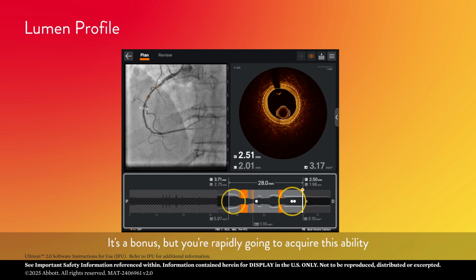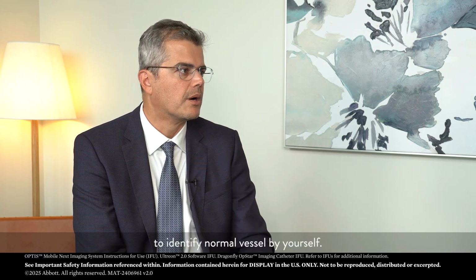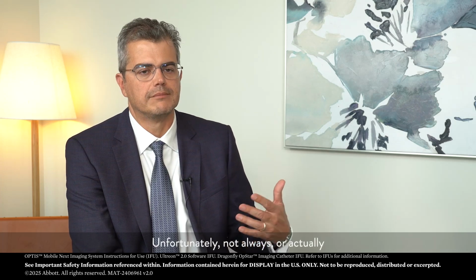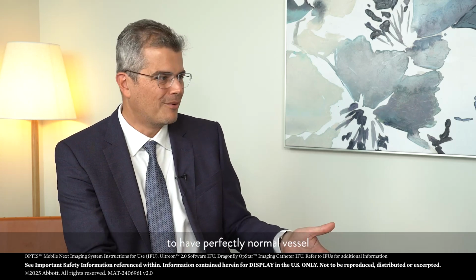It's a bonus, but you're rapidly going to acquire this ability to identify normal vessels by yourself. Unfortunately, it's unusual to have perfectly normal vessel on both proximal and distal edges.